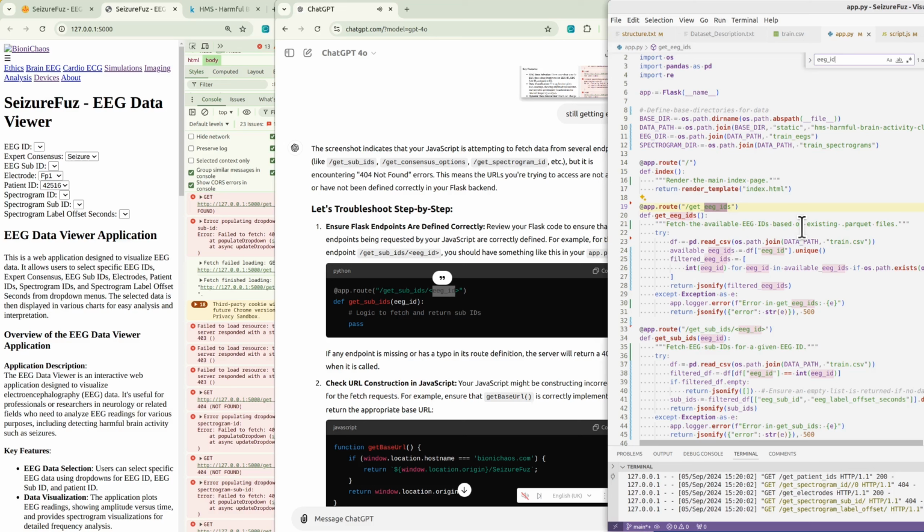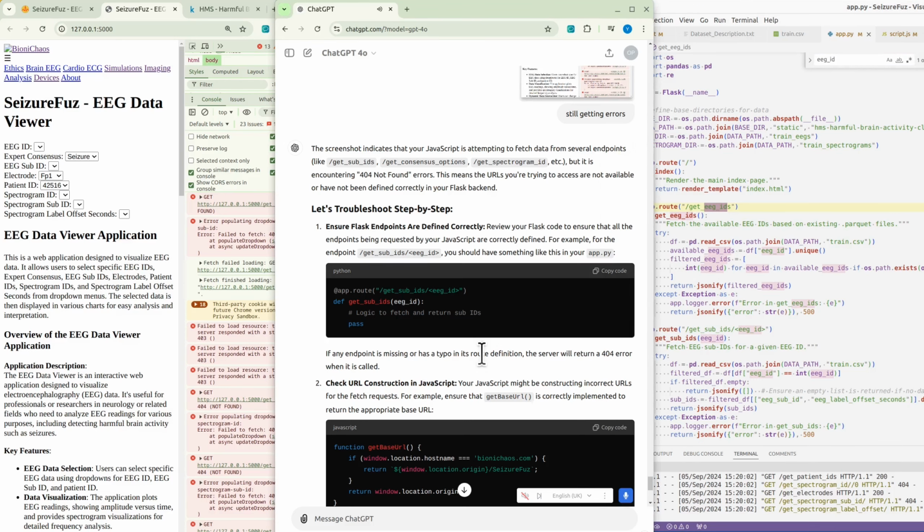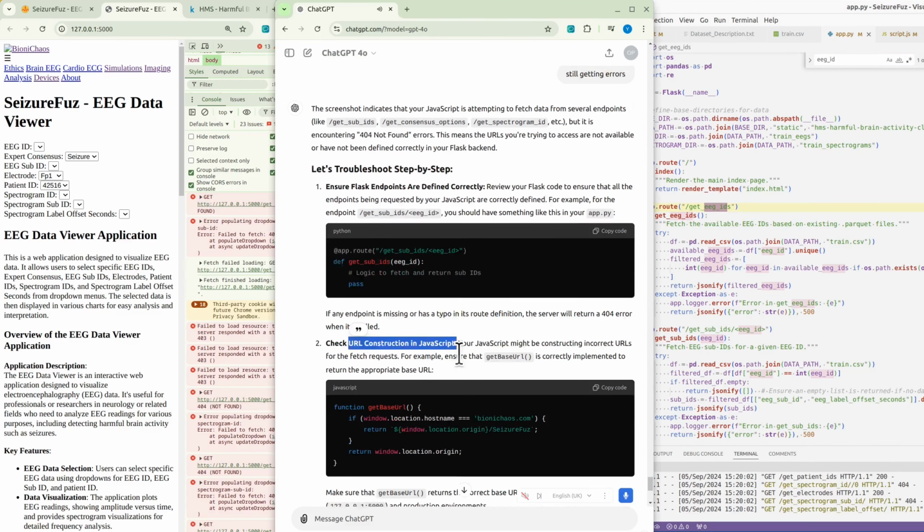4. Enhanced error handling and user feedback. The new code is designed to be much more user-friendly. We've added more comprehensive error handling throughout the script to ensure users aren't left in the dark if something goes wrong. Instead of simply failing, the code logs clear messages in the console that explain what went wrong and why. This helps developers quickly pinpoint any issues and makes troubleshooting a breeze.